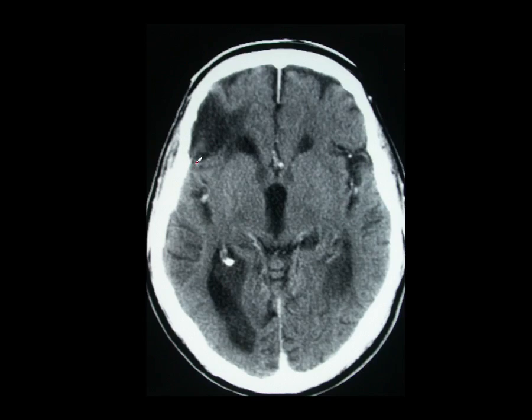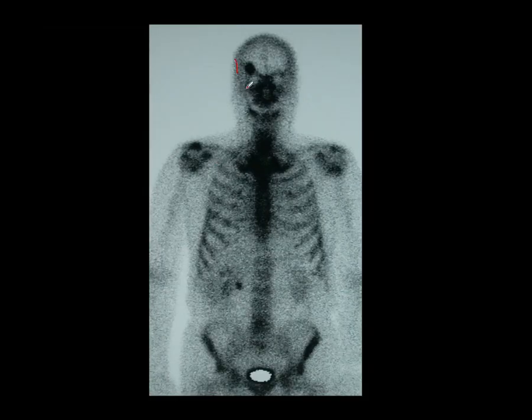that. You can actually get tracer accumulation in meningiomas as well, but in this case it was just an old area of infarction. But it might be important to notice that, because of course if this was an asymptomatic infarction, it would be very important to initiate secondary prevention measures for the patient, not to mention not diagnosing this as a metastasis. That's obviously very important.